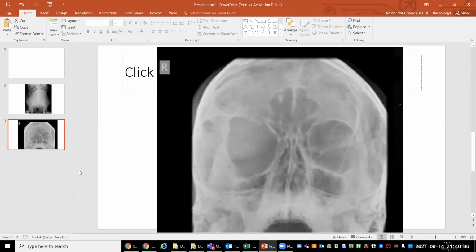Okay, what if I tell you that this patient does not have neurofibromatosis? Is there another thing that you can think of? What if I tell you that this patient has breast cancer? Breast cancer? Okay, then I would be suspicious that the patient could be having some sort of metastatic disease to the skull. In that case, I would like to refer the patient for CT of the brain to see exactly the distribution of the affected bones and the distribution of the metastatic deposits, if there are.